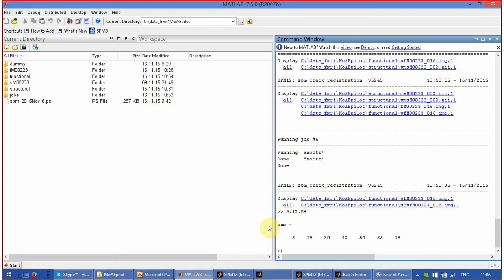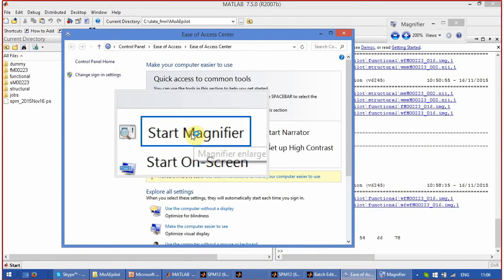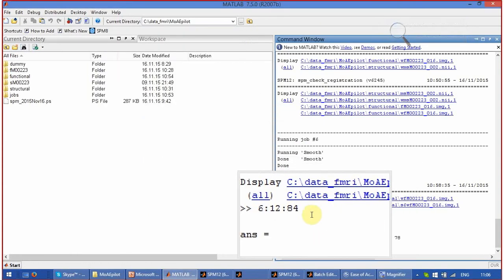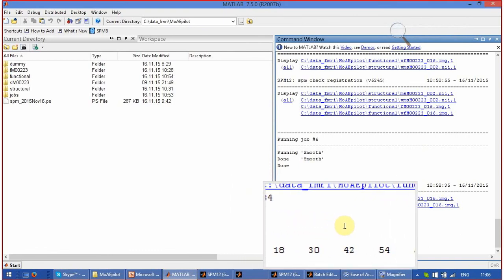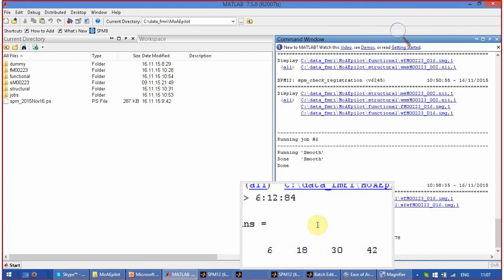You just copy and paste in MATLAB and this will give you a good idea of how MATLAB works with data arrays. This is the good way to indicate the onsets, since our step is always the same: 6 scans rest, 6 scans activation, rest, activation, rest, activation.